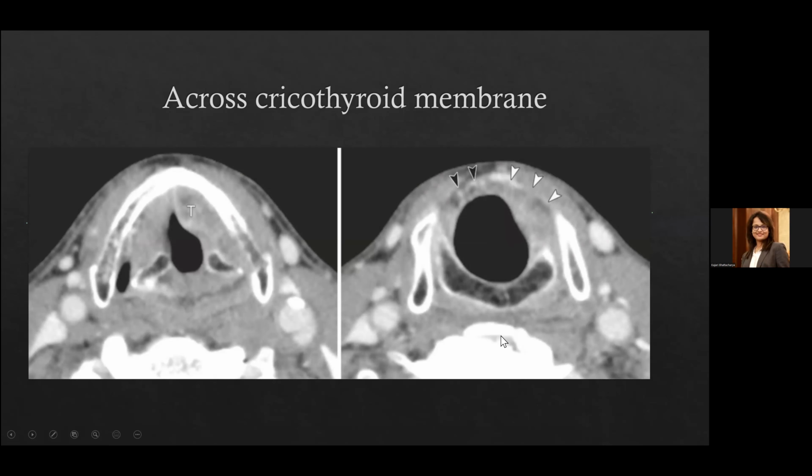So here again we are identifying these two vessels. These are basically the internal jugular veins, and this is the common carotid vessels. So this we have to see very clearly. One atherosclerotic plaque is also seen in this case. If there is any significant disease burden in the form of atherosclerosis in the neck vessels, that also ought to be reported, which can have consequences post-procedure due to infarct and stroke.